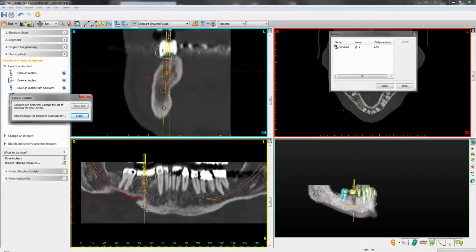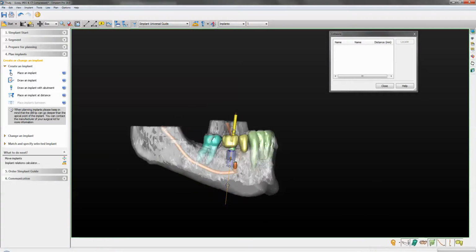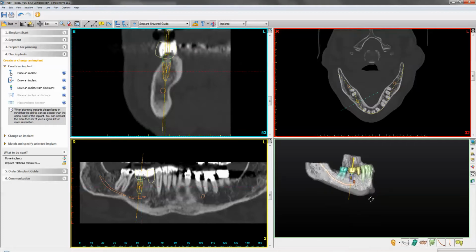You can either rotate and angulate your implant. That should give you the option to fit it in a little bit better. It also follows the axis of the neighboring tooth. So if anything, you can actually bring that in more. Okay, all it is is spending some time manipulating the implant positioning. You just need to make sure that you're not colliding with the nerves.